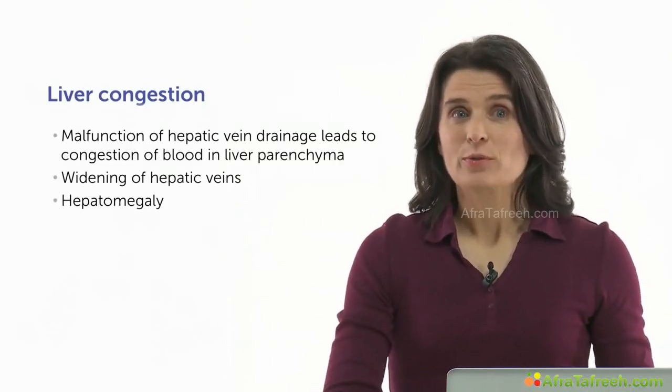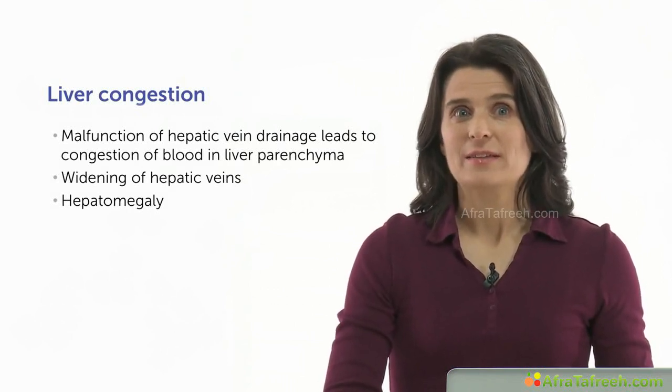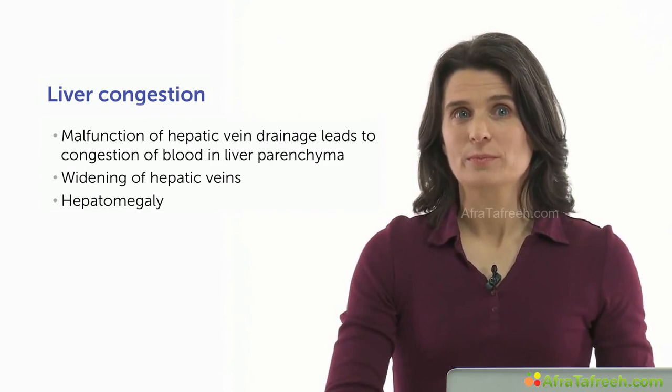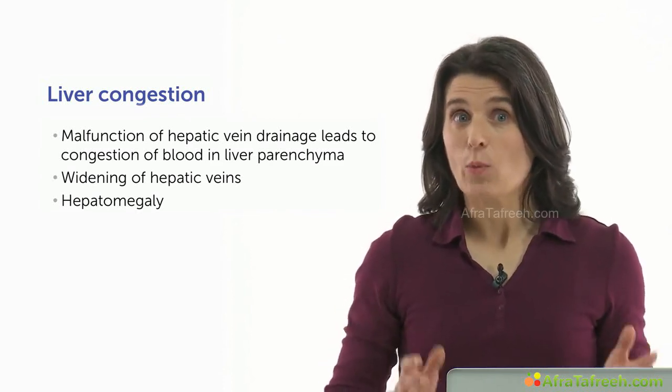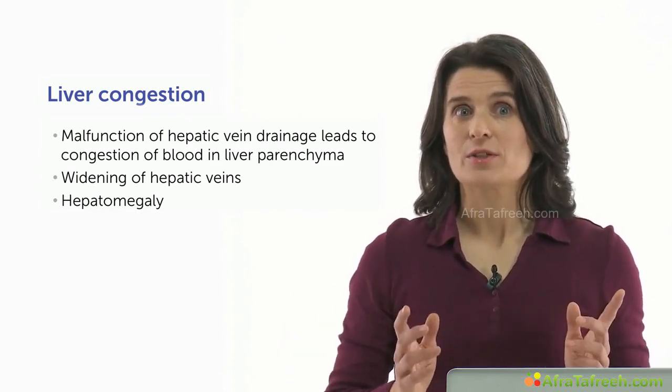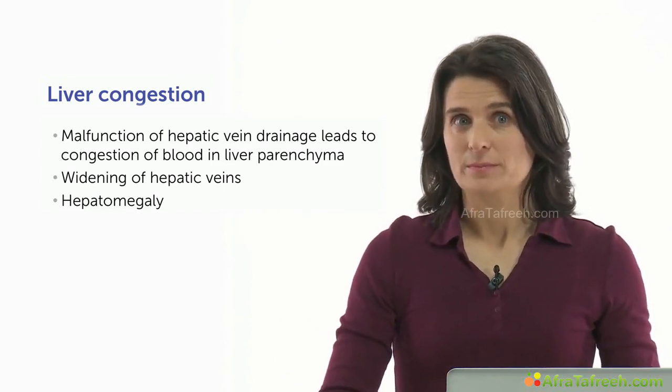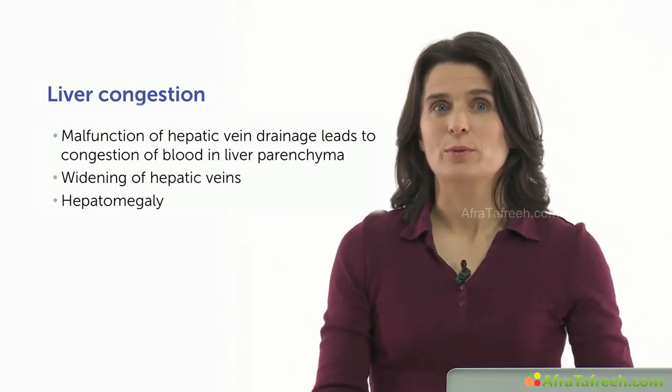Hepatic venous outflow is impaired, there's elevated hepatic venous pressure and decrease in hepatic venous flow. The hepatic veins are widened and the liver is enlarged because of the congestion and the stasis of blood. There's hindrance of venous outflow.